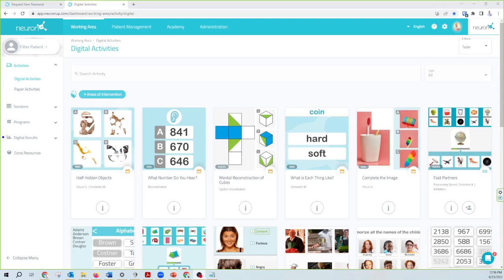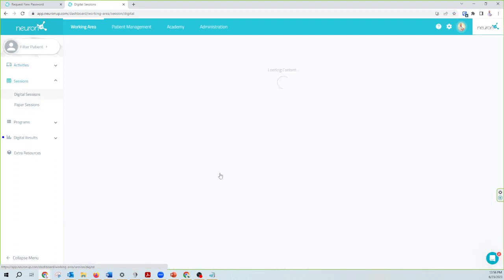Hello, and welcome to this video where we'll show you how to use the templated sessions of NeuronUP. Here I am in the main working area. I need to go here to Sessions, to Digital Sessions.